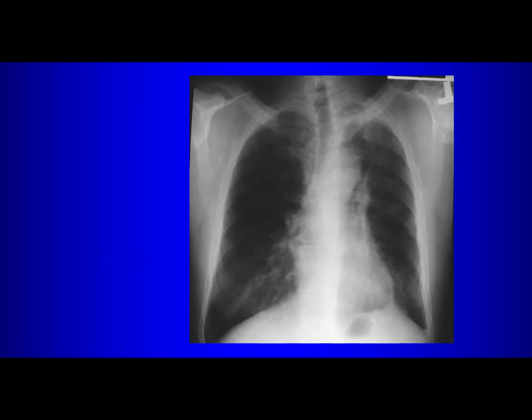Is there other evidence of volume loss on the chest radiograph? The left hilum is elevated. Yeah, so the left hilum looks like, see, these vessels are stretched, the left hilum is elevated. We said that elevation of the hilum is always a good sign for left upper lobe collapse. And does the left lung look smaller than the right? Yes. Is the heart shifted to the left? Yes. Yeah, all of these are observations that you need to be able to make on the chest radiograph.